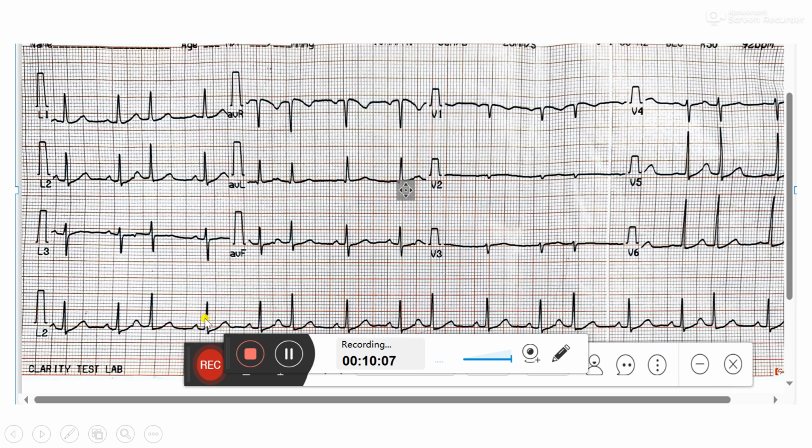See, in this ECG, every beat is regular, but in the meantime, somehow this wave is coming and making it irregular. But this wave is also coming in a regular manner. It is regularly irregular.